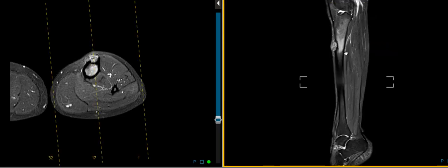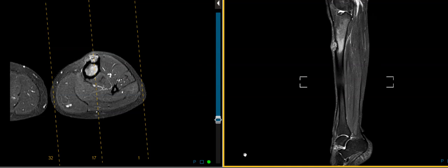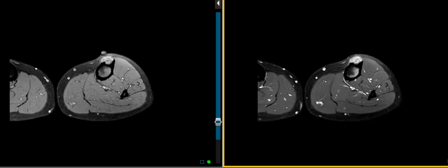Here we see the sagittal view in that mottled, characteristic, speckled chondroid matrix. We see the reactive marrow edema. There's brightness in the bone here, the medullary cavity, and that means that there's some reaction. This is expansile, putting pressure on here. We have reactive marrow edema, but there's no pathologic fracture. And we have one more set of images, and these are the fat-suppressed pre- and post-contrast images.